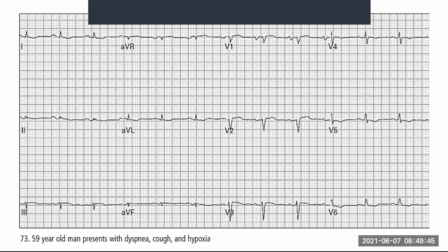Does it make a difference to your life? Not really. Okay, it's nice if you pick it up. One of the physicians will come and give you a pat on the back, and that's about it, you know, but it's not essential to your diagnosis, all right? The more important thing is to pick up that poor R wave progression. So it's something that you've got to look at.